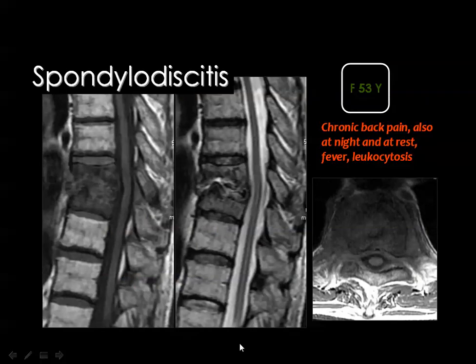This is also a spondylodiscitis, or inflammation of the spine and the disc. The two vertebral bodies as well as the intervening disc are inflamed. The disc showed bright signal in the T2 weighted image, denoting the increased water content due to infection, and the bone marrow edema affects the vertebral body above and below the disc.